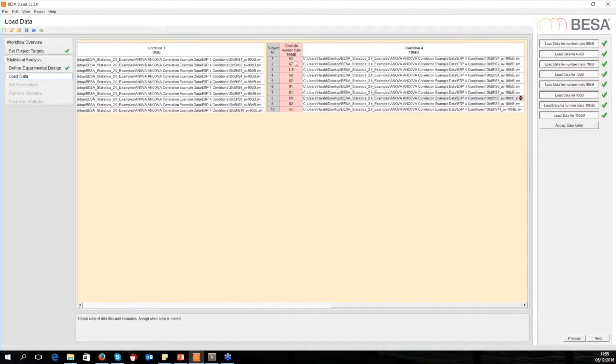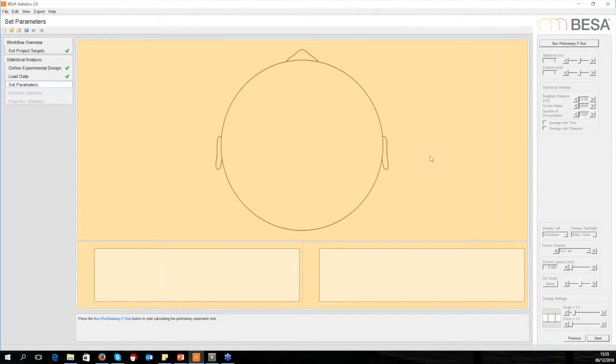This is important for the right covariate to be factored into the equation with the correct response, but also if I do my permutation testing, permutation shuffling, I want to make sure that I shuffle the conditions between the correct subjects. Okay, then go next.